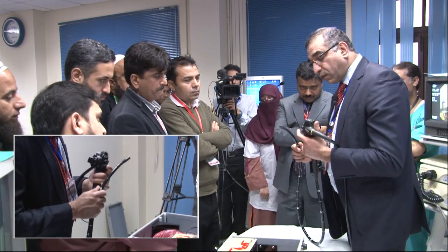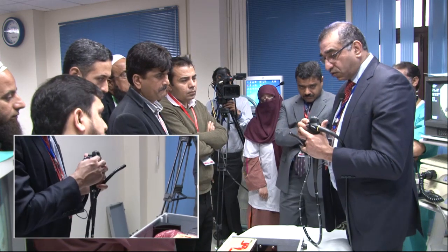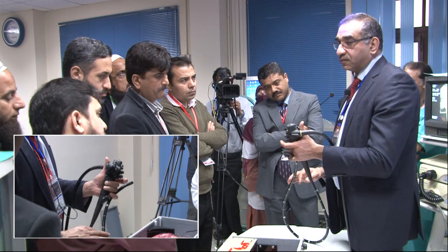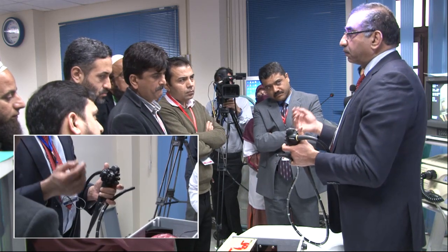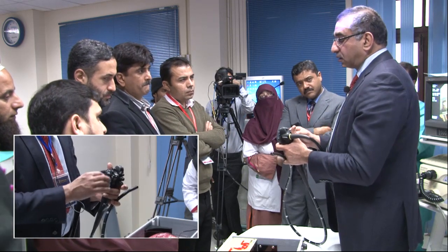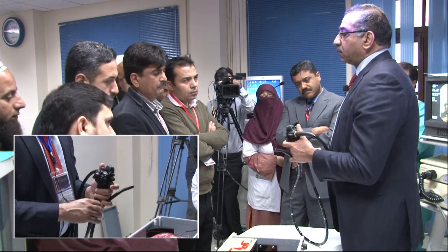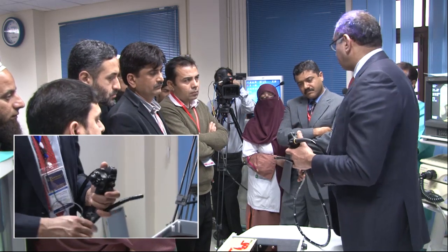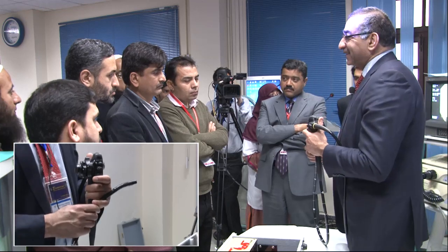Secondly, when you are cleaning scopes, you should remember that there is a channel associated with the bridge, and that's why your staff members who are dealing with cleaning should clean that channel as well, because if they are not aware of it, you can get infection transmitted through that as well.